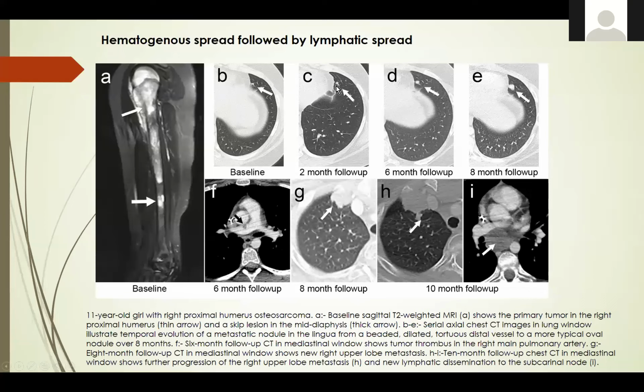This is still tumor in the distal pulmonary vessels, and then it maybe breaches out of the parenchyma. So this patient, in addition to what we know at surgery as multiple tumor emboli in the small veins, developed a small embolus here in the right pulmonary artery at 6-month follow-up. Since I already knew the patient had tumor thrombi, we called it a tumor embolus, but there's always a potential for mistaking these emboli as bland emboli.